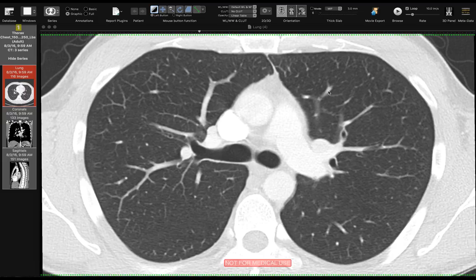And plus, if the patient ever gets radiation or they have surgery and the anatomy gets distorted, knowing the segmental anatomy will help you figure out where things are. This is a CT of a normal patient, and I'm just going to take you through the lobar and segmental bronchi. So here we are at the carina here.